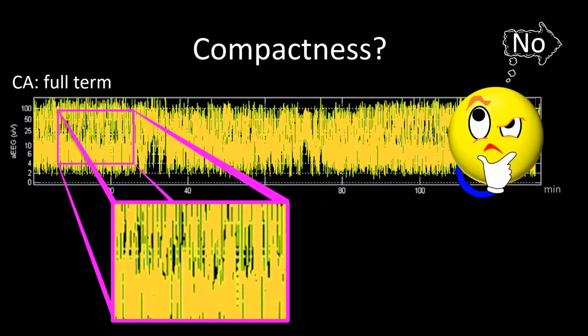The decision whether the lack of compactness is normal or pathological is done by considering conceptional age. Absence of compactness in a full term is abnormal.